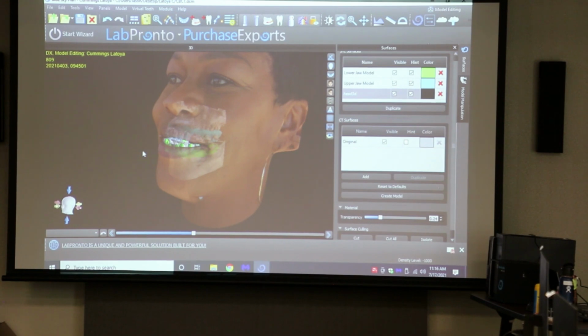But you can get the point of how you can get this. Play with a few scene viewpoints. And then once you have that, you can click the head, and make it easier for yourself, you can adjust the transparency so you can see her face, and you can toggle on layers. You can do a transparency slider if you want. Your CBCT is a little bit too far down, so set it back. You can mess with all that stuff.